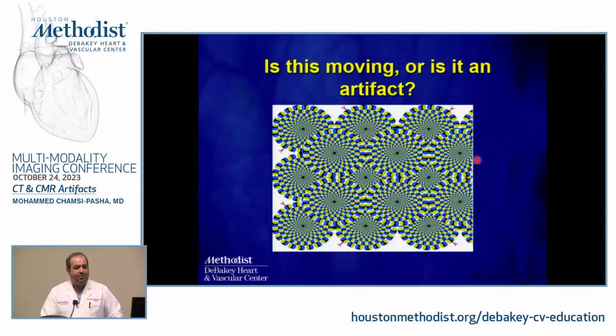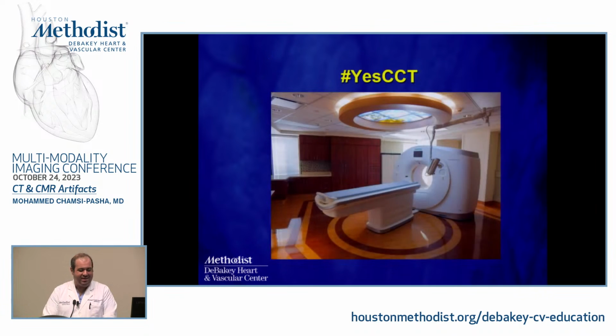So to start up with here, Malik, is this structure moving or is it an artifact? Looks like it's moving. All right, well, my friend, this is a delusion because none of these circles are actually moving, and this is what we're going to try to slice and dice with regards to artifacts.